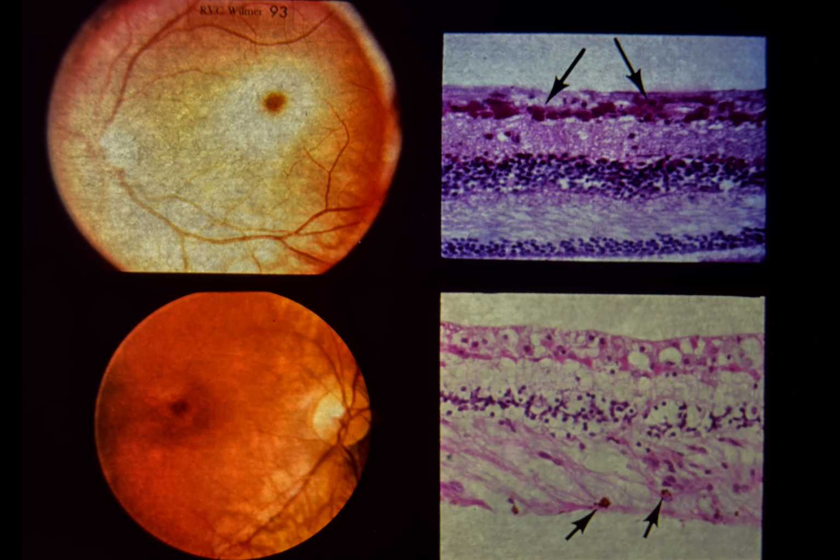The left optic disc is normal. An opaque white retina surrounds the dark red fovea. The patient developed progressive generalized muscular weakness and died 6 months later from a respiratory infection. Upper right. A histologic section of the macula in a similar patient shows ballooning of retinal ganglion cells by a dense material that stains positively for lipid. The retina is otherwise normal.